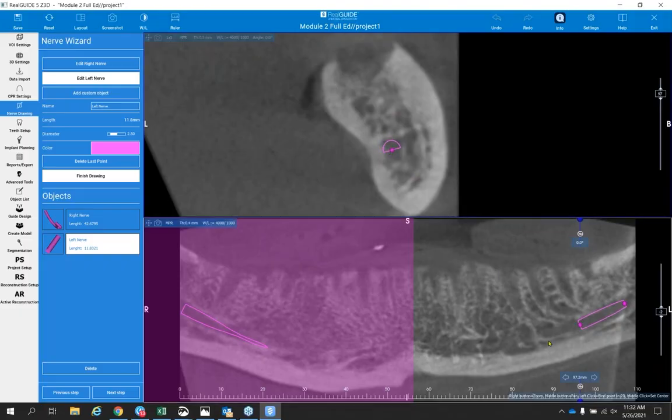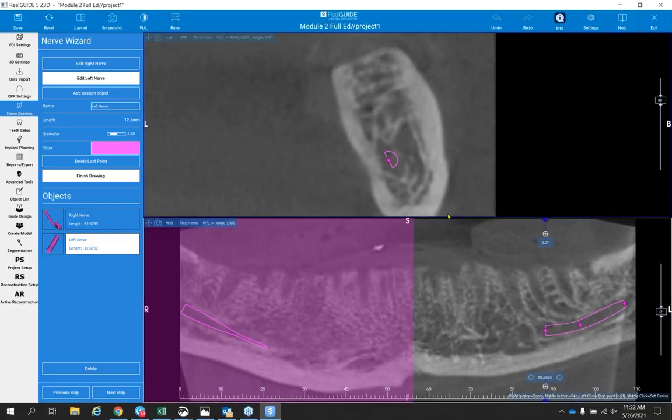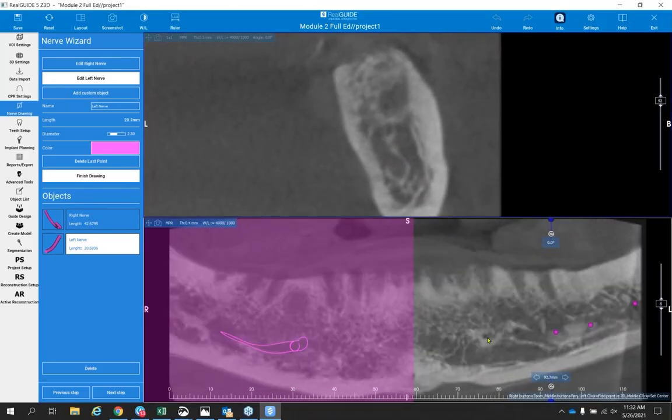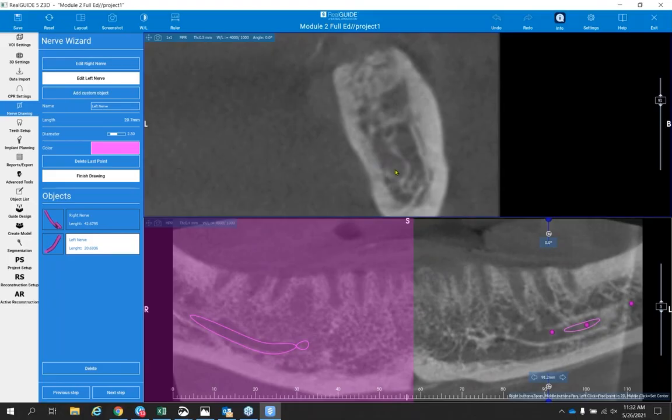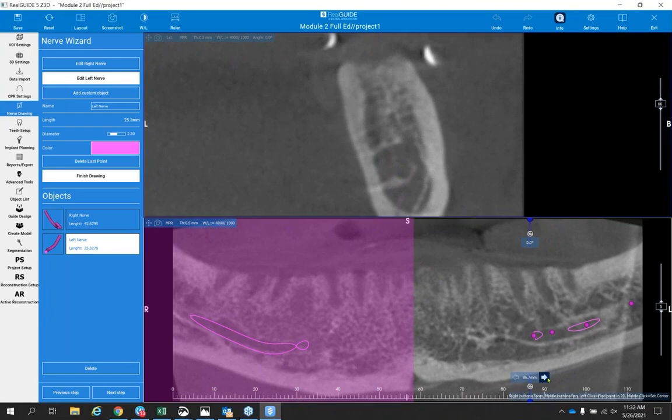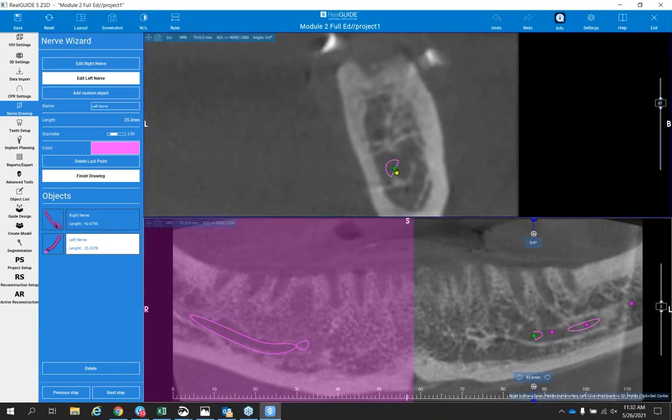But important, because I see a lot of cases where the doctors are planning for implants in the posterior mandible with locators. I call it kind of a quadrupod design, where we are putting implants back in the posterior. I'll drag that forward a little bit. Okay, and again, I'm going to use my slider just to come forward. I feel like that is out, right? So we want to get that back in the canal. All right.